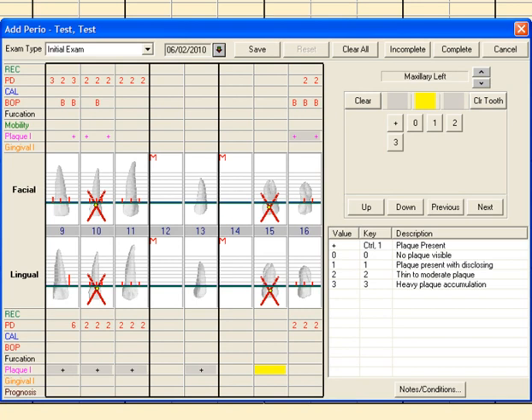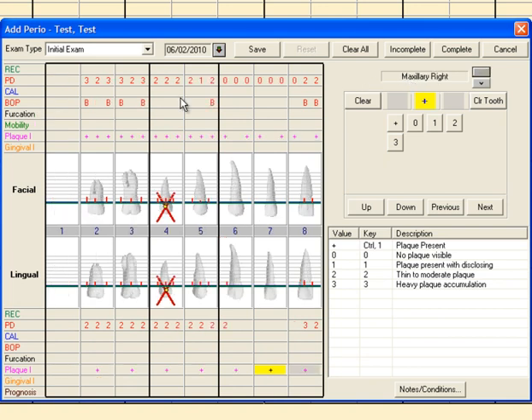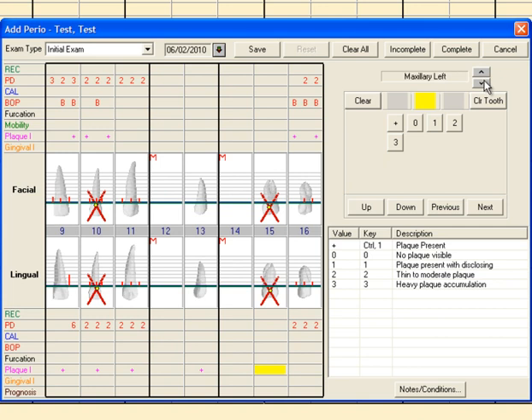So let's review for a moment what we've attempted to accomplish today. We did periodontal pocket depths or probing depths. We recorded 3 sites per tooth. This line automatically advances itself. The program has a default to advance you to the next quadrant, to include all the facials. As we go from the upper right quadrant, the program will advance itself automatically to the upper left quadrant.